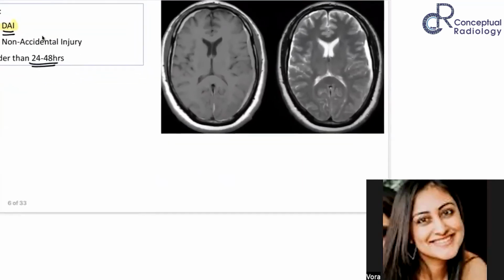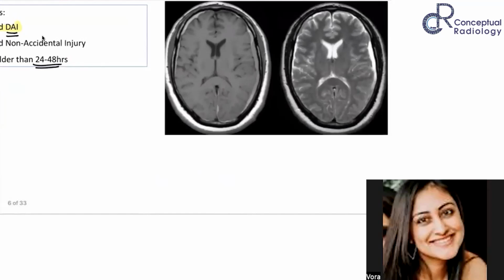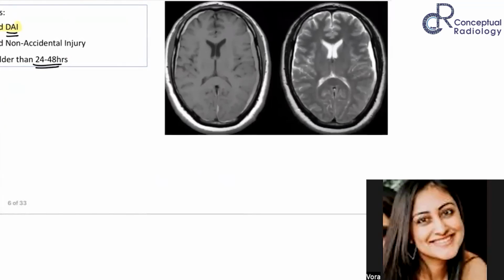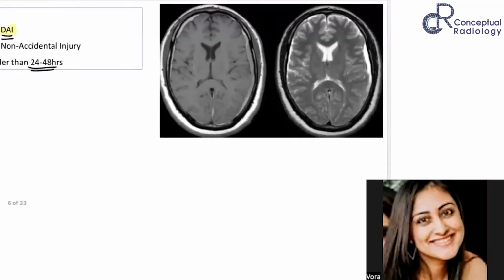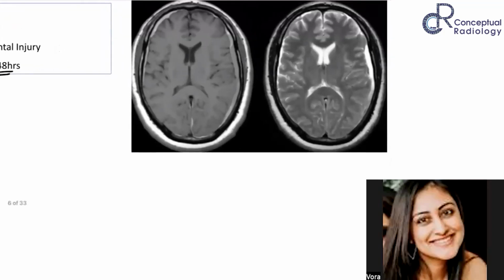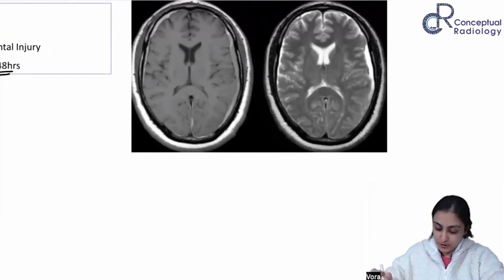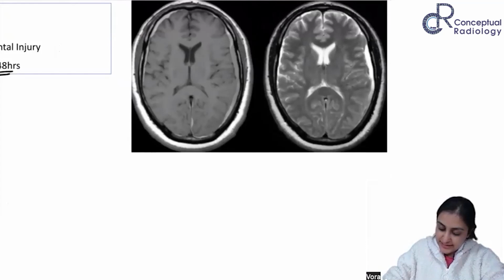So this is what we are seeing here as well. Look at this on the MRI. Can somebody tell me where is the hemorrhage? If you can pick it up. Okay, I think my camera will work now. So if you can just look at this MRI in the meanwhile and tell me right side, left side, what do you think is the finding here? SDH, right side, left side? Left. Most of you are saying left. Okay. So you are seeing this, I guess.